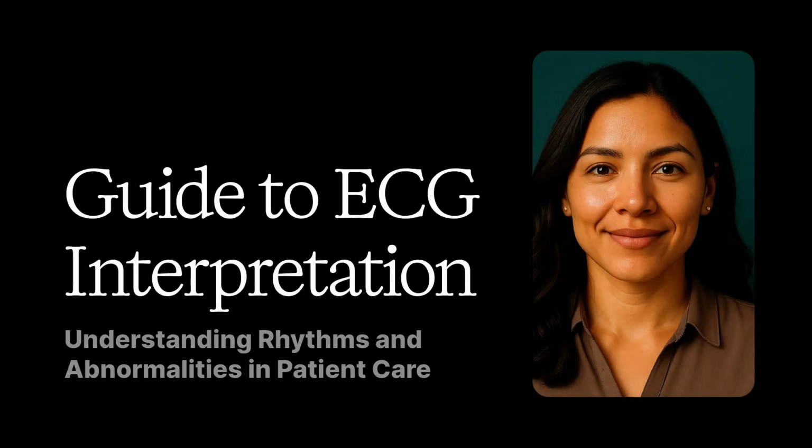As nursing professionals, understanding how to read and interpret ECGs is a crucial skill that can make a significant difference in patient care. In this video, we'll cover everything from normal cardiac rhythms to critical abnormalities, and we'll finish with some practice questions to test your knowledge. Let's start with the fundamental components of an ECG.